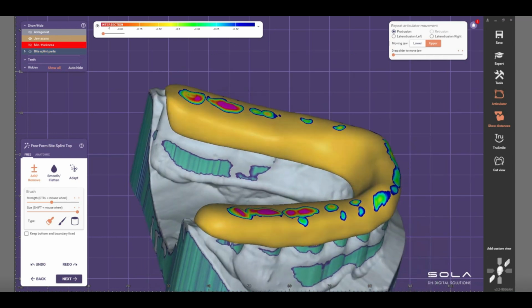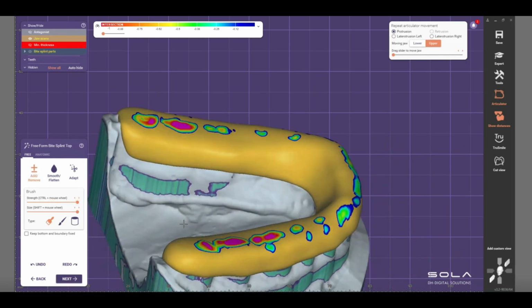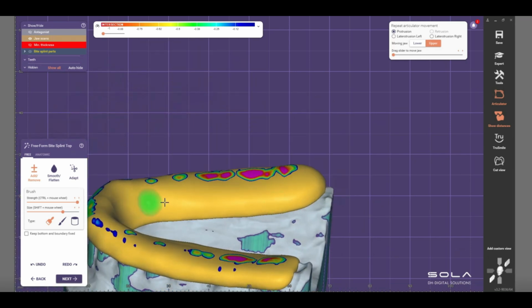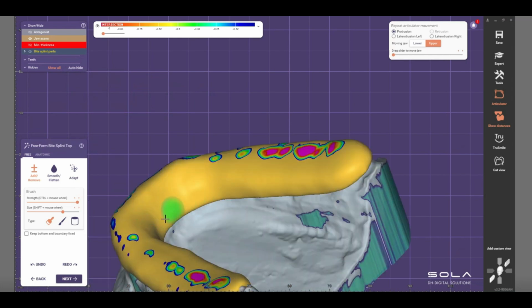I'll add a little bit on the edges as well. Slightly on these edges to make the edges more prominent. So I'll make sure that the edge is more prominent. On this edge, give me a wall kind of appearance. Add on that side as well. Add a little bit over here.